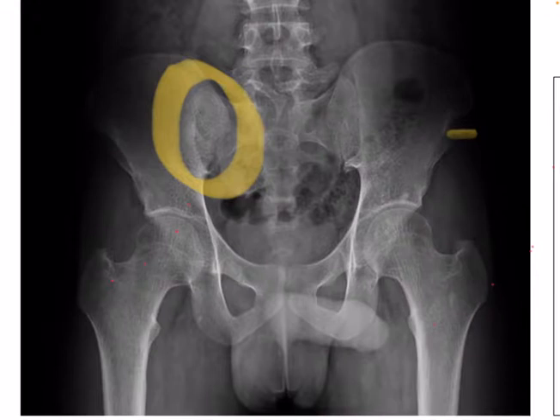So the black areas that you can see here near the joint may be the soft tissue involvement of the inflammatory process. If you want to give a conclusion for this, you don't know whether it is primary or secondary.